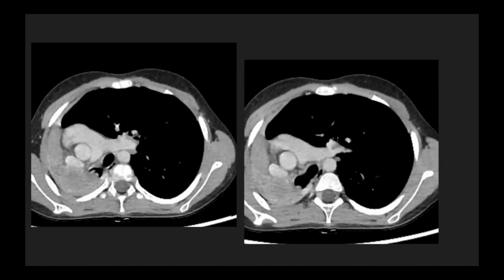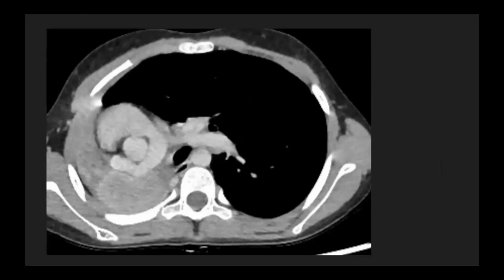Anyway, for planning surgery or biopsy, CT is needed. But ultrasound additionally gave us much more clarity about where to take the biopsy from and what the exact extent of the lesion is. And here is a blown up image of the same. We could see that the lesion was a little more enhancing than the pulmonary parenchyma.